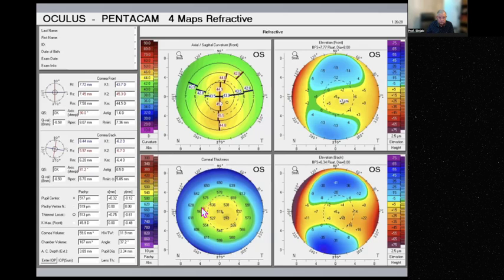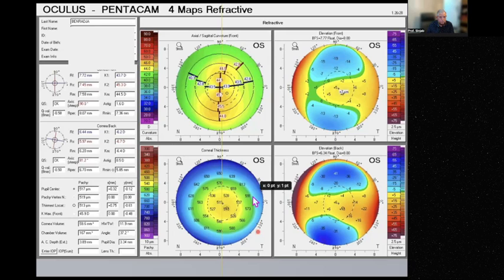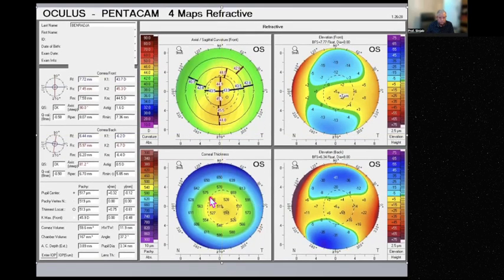If you see this pattern, displacement down and temporal, then you may think of eye rubbing. The patient is rubbing because the hand comes from down temporal to the eye. So always think about rubbing the eye. And this may explain why there is inferior hotspot.